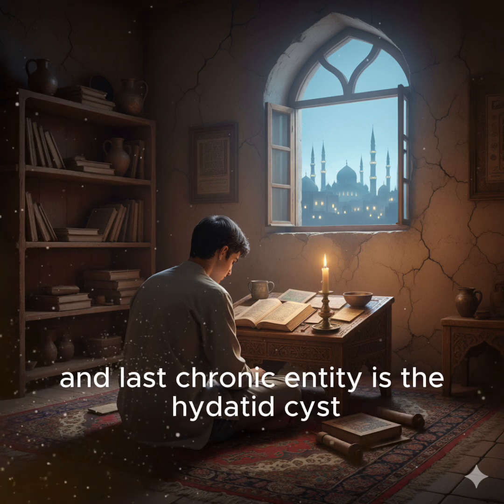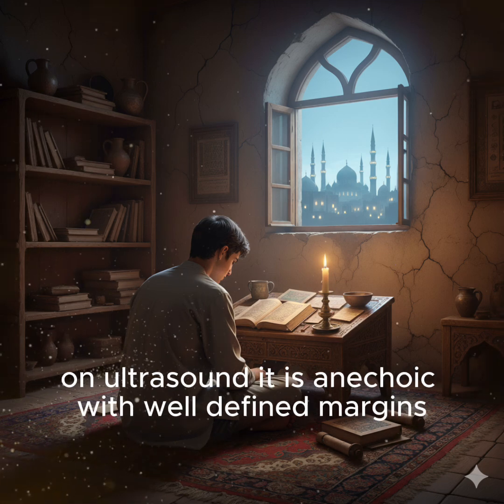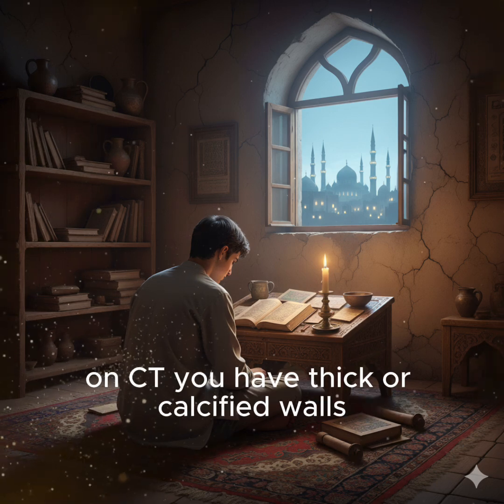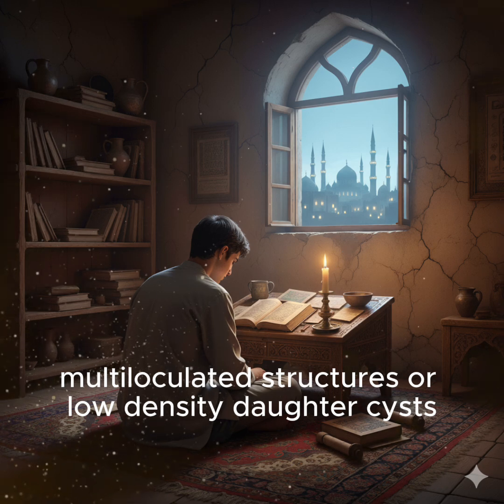And last chronic entity is the hydatid cyst. On ultrasound, it is anechoic with well-defined margins, sometimes showing the water lily or spiral signs or falling snowflakes. On CT, you have thick or calcified walls, multiloculated structures, or low-density daughter cysts.